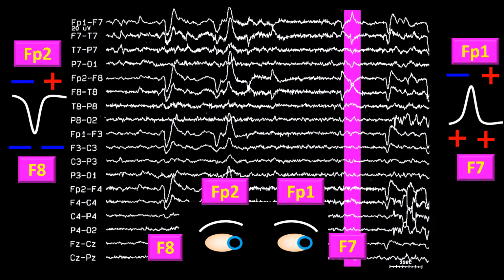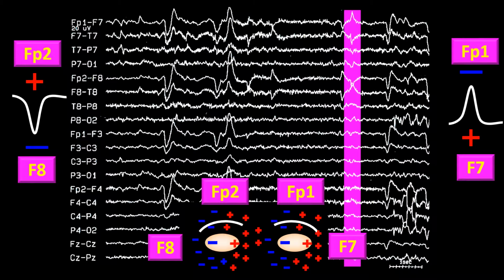Here you can see the epoch again that was in the question, flanked by the schematic representation of the eye movements with their polarities. The polarity here displayed is a consequence of the direction or the position of the cornea and the retina in the different eyes, and the interpretation made of that arrangement by the electrode's position.